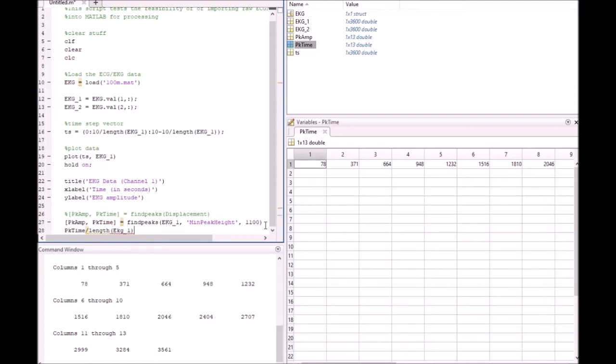If you hard code it to 3600 and you put in a different EKG data set, or you have live data streaming in, it'll mess it up. So you really want it to change basically. You could have a data set with 100 seconds, or 20 minutes worth of data, or if you have an overnight heart monitor where the patient takes it home with them, that would be approximately 24 hours of data, or 23 hours of data. And so you really don't want to hard code it. You want to set it to the length of whatever it is.